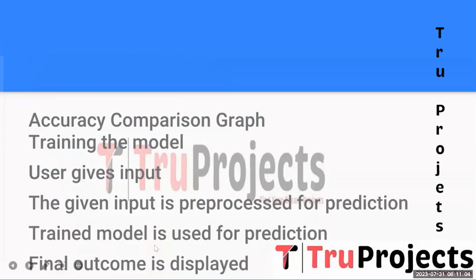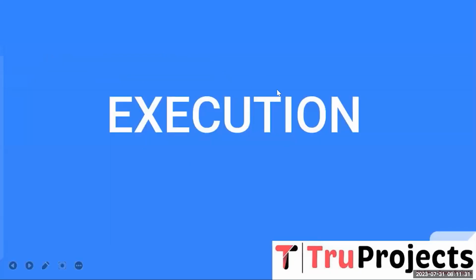And the next one is the trained model is used for the prediction. The pre-processed input image is passed to the trained model, which extracts the relevant features through the CNN and applies the selected ML algorithm for the prediction. And the next one is the final outcome is displayed. The model prediction result is presented to the user through the web application. The output displays the severity of the diabetic retinopathy associated with the uploaded retinal image.